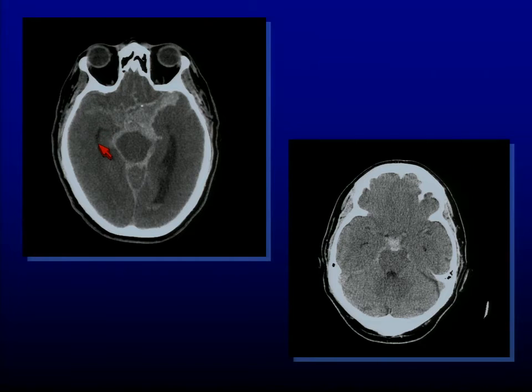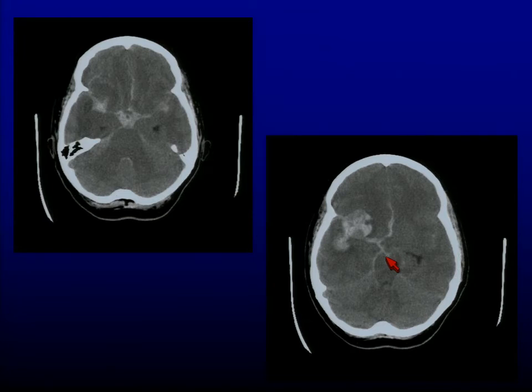You see that temporal tip, however, for this much blood, this person actually has a pretty nice looking temporal tip, though I'm not super excited about them having the acute hydrocephalus. A little more subtle on this one. You see there's a blush of blood. Again, I want that suprasellar cistern to be black, and I got that blush of blood right there, and I can see there's some blood tracking around in that circummesencephalic cistern.